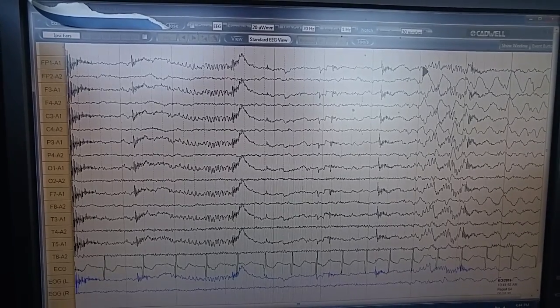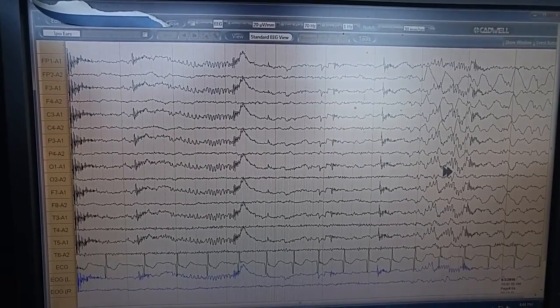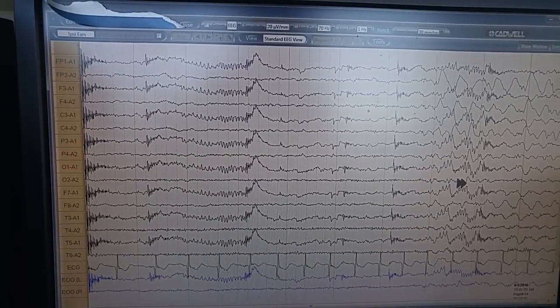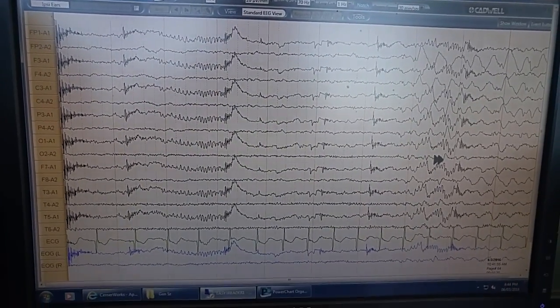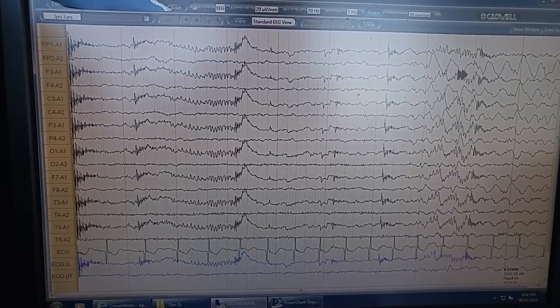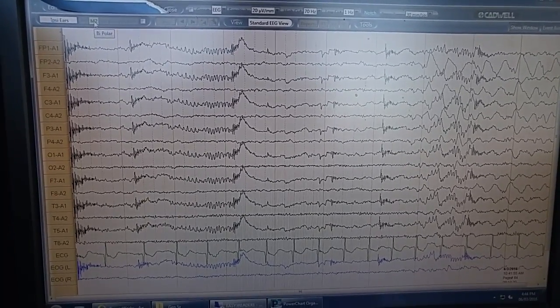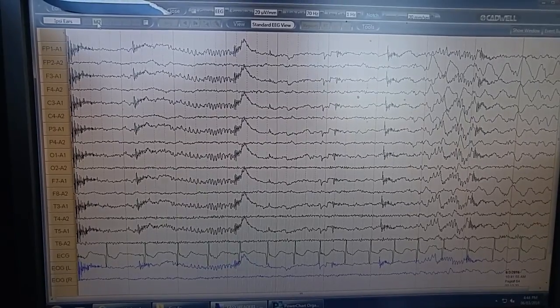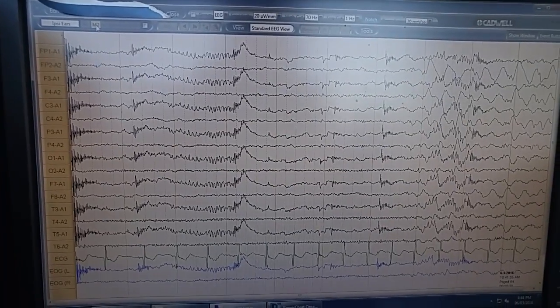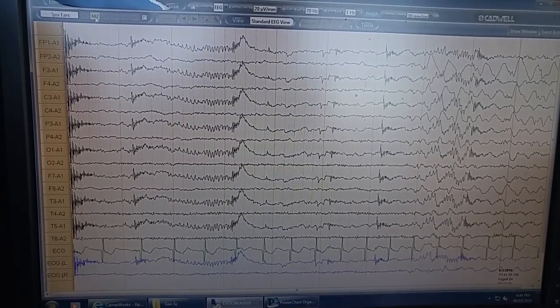And that is why here on the left hemisphere, it looks as if you don't have as much generalized spike and wave activity compared to the right side. So this does not mean that this is right side predominant with quick spread to the left. It just means that there is a cancellation effect from the active A1 electrode. So I just wanted to use this as a good example of that, because you see this 3 hertz spike and wave in cases like generalized absence epilepsy, and it's usually very beautiful, textbook-like, but this just shows you that it doesn't always look that way in real life.